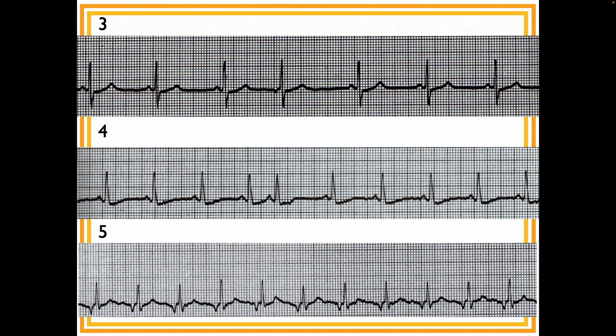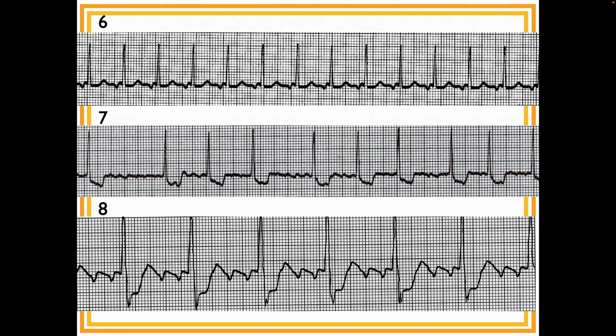So accelerated junctional rhythm. Yeah, and it's right on the border with accelerated and junctional tachycardia. Again, it's one of those borderline rates. So accelerated's fine, junctional tach is fine, borderline junctional tach is also fine. Okay? Whoever is next.